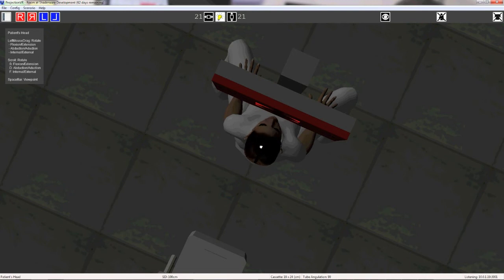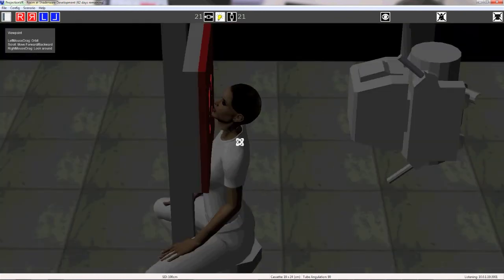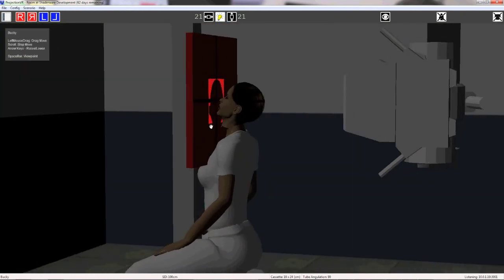These future possibilities are exciting, but we realise that you will be busy and already have a lot of lessons prepared. This is why 14 outcome-driven and timed lesson plans covering 9 hours of lab time come pre-prepared with Projection VR. As a licensee, you will obtain permission to copy these and modify them as you see fit for your teaching.